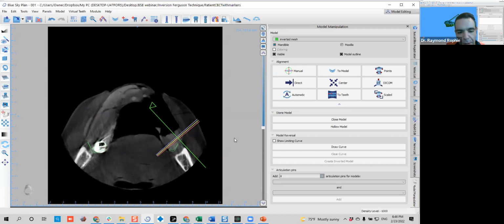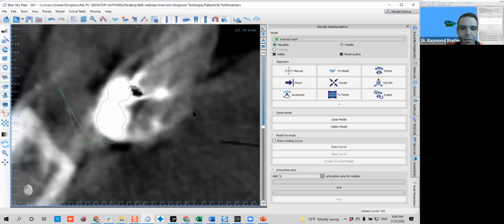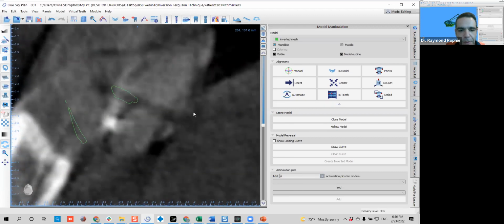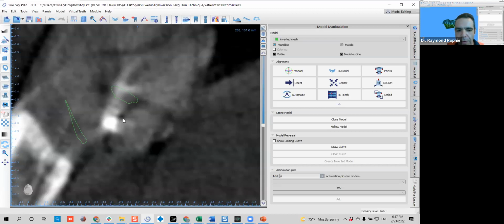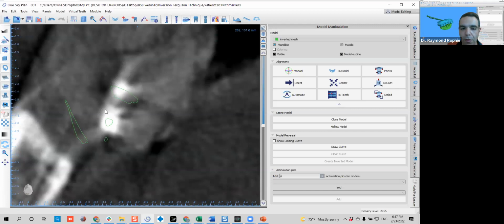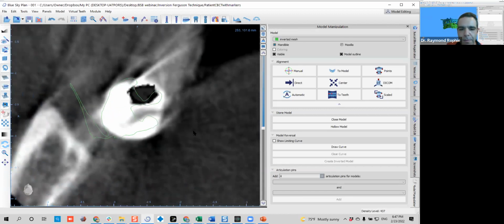Here, for example, I do, let me just stress this. So here, the model will start showing the cusps, right? As long as you start seeing model, you need to start seeing or watching the outline of your model. Again, we were saying that we have some discrepancy on the occlusal and incisals, right? Here we have part of the crown and we don't have model yet. So that confirms what we were looking. Okay, now appeared. And we continue looking for the same cusps, etc., etc.